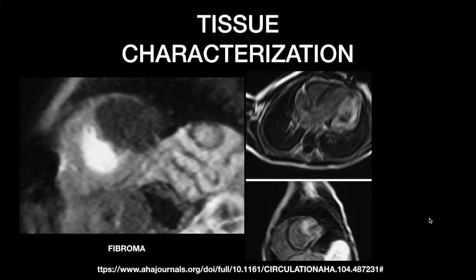We have to evaluate the lesion in all the axes possible along the orthogonal planes, describe its character, describe which wall the lesion is attached to, and whether this is causing any abnormality in the function of a wall or a cavity.